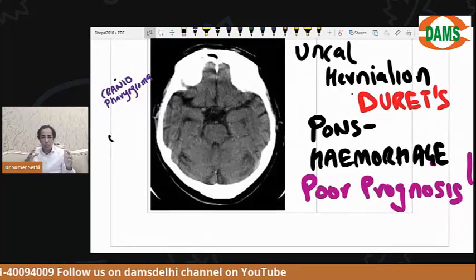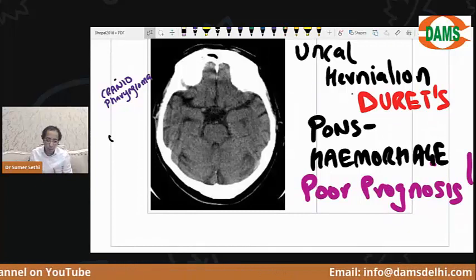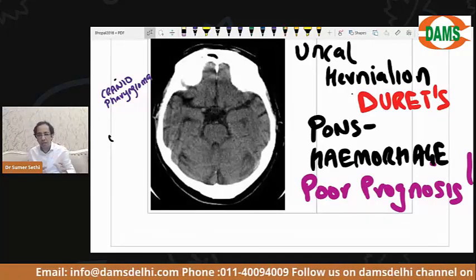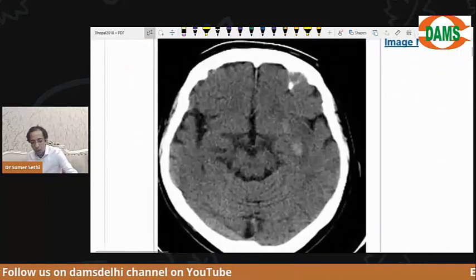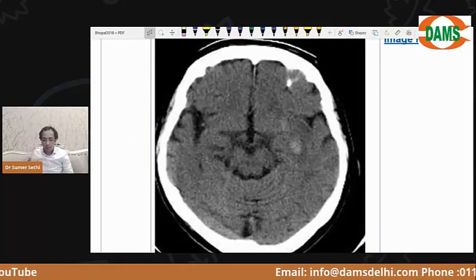Okay. So I have given you an idea on amygdala, uncus, hippocampus, pons, suprasellar cistern, and we've talked about a branch which everybody forgets, an artery called the anterior choroidal artery, which supplies the hippocampus. Okay, let's move ahead. So now I am going upwards, from below upwards in the brain.